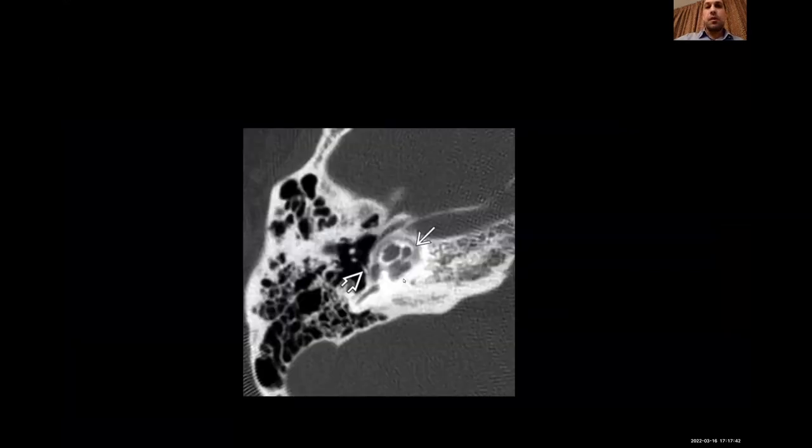Okay, just let me describe, give me description. I don't want diagnosis. I want description in this case. What is the pathology? What is the abnormality which hits your eyes? I cannot see any messages on the chat, please. So try to say anything. What is the pathology? Okay, no worries, no answers. Okay, great.